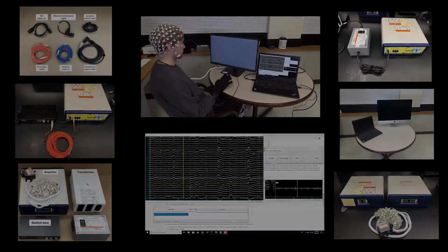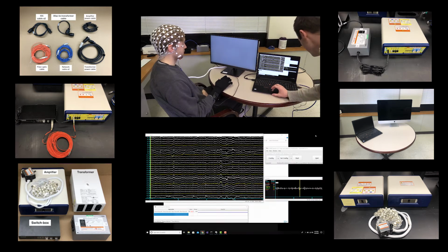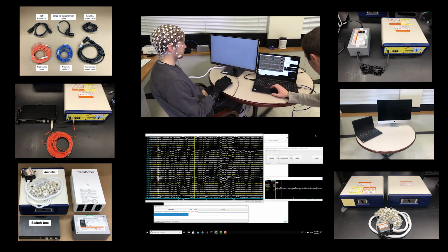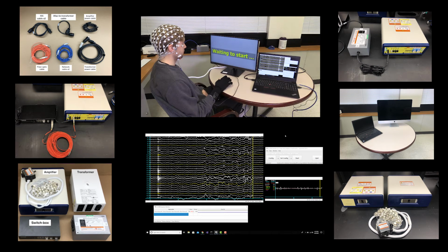Welcome to the EGI video, where we will be discussing the necessary steps to connect your EGI EEG amplifier to BCI2000 and what features are available should you do so. We will run through an example experiment and demonstrate the setup and some of these features.